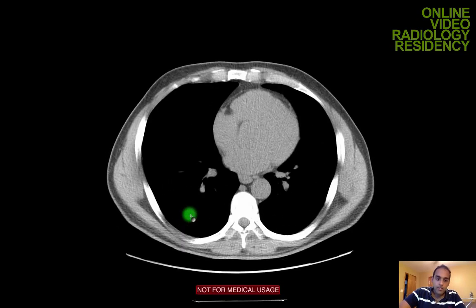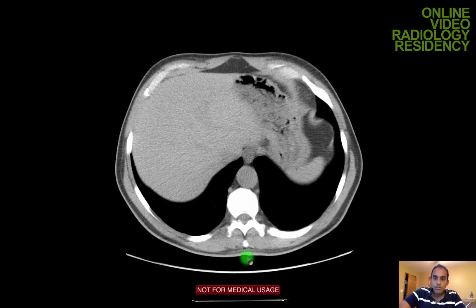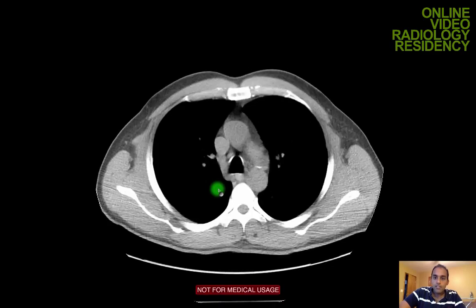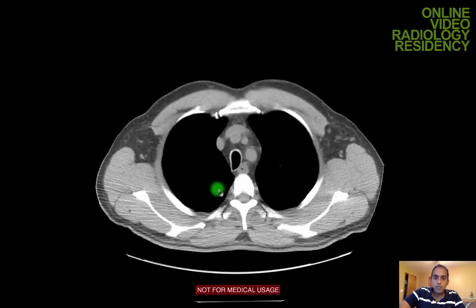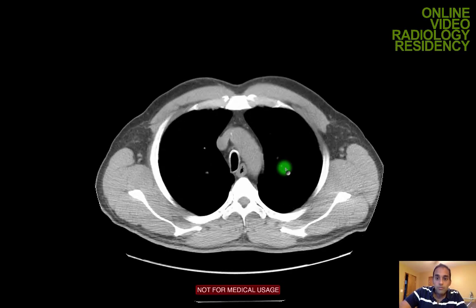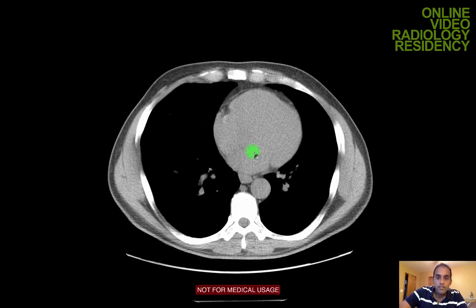And let's keep coming down here. You can see this long, flat, broad muscle, the latissimus. These are the deep back muscles. So I'm basically looking for any obvious soft tissue lesions. You don't typically make a lot of findings in the soft tissues, but sometimes you can make specific diagnoses. For example, if there's absence of the left pectoral or any of the pectoralis muscles, that can be a diagnosis of Poland syndrome. In a female patient, I would look at the breast tissue to look for any masses or any other focal lesions.